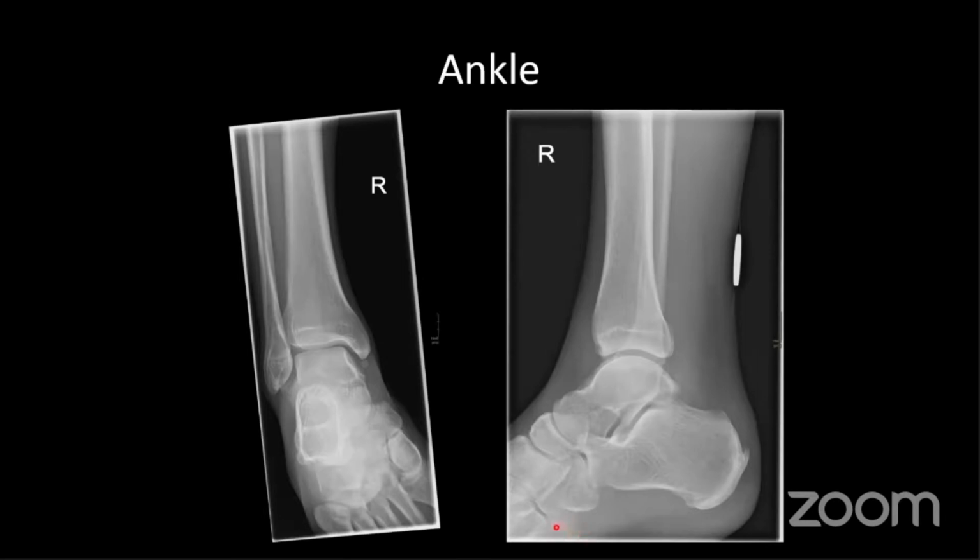Do you know what structure inserts into this? So it's the peroneus brevis. Yep.